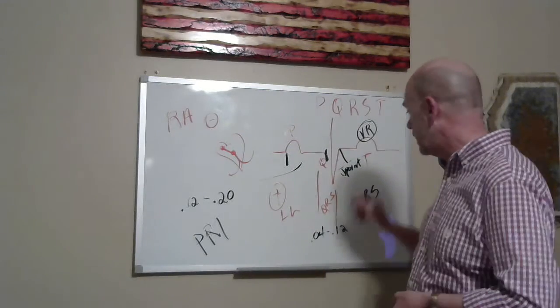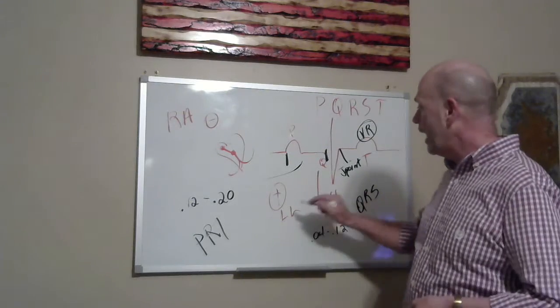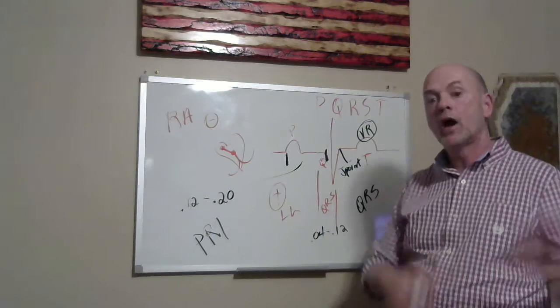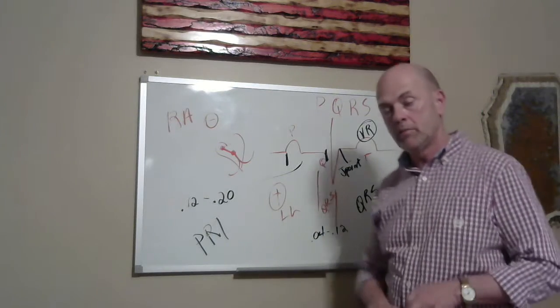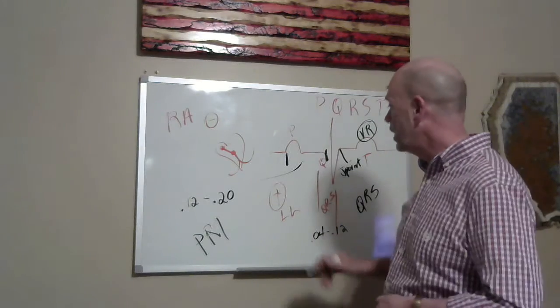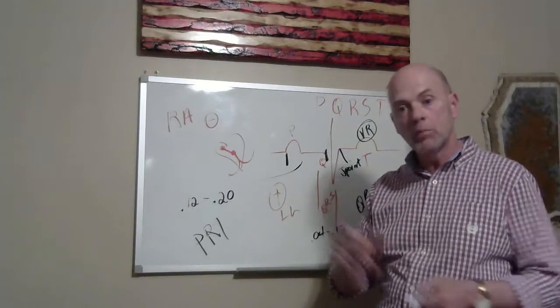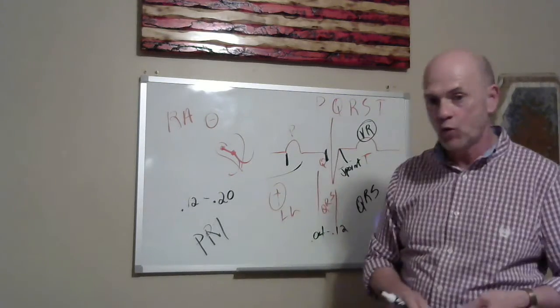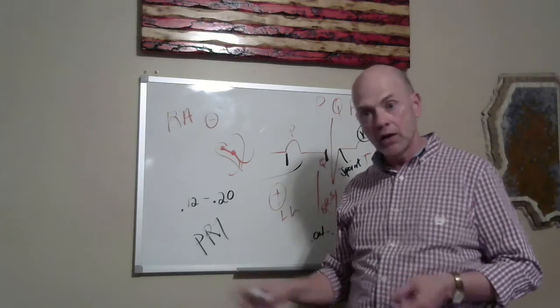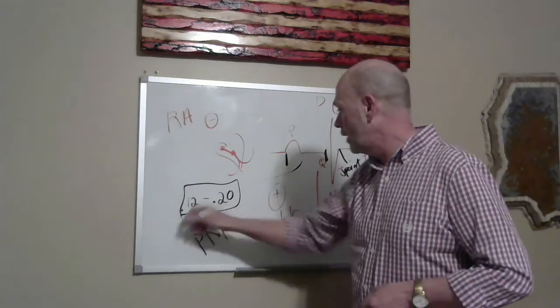It doesn't come up much at this point in determining rhythms. But without knowing these normal limits, you're not going to be able to interpret rhythms and arrhythmias. What is 0.12? One tiny little block on your EKG paper is 0.04 seconds, so the PR interval is between 3 and 5 of those tiny little blocks.